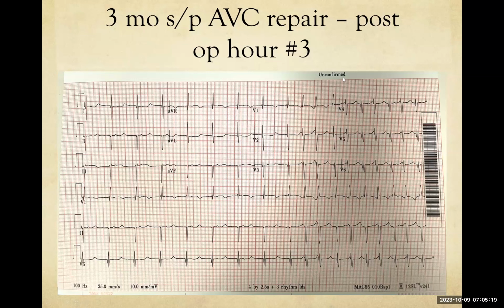Very good, Molly. So we're looking on the left-hand side of the screen. We see, just like you pointed out, I'm pointing here in lead 2 to some upright P waves that seem to be following the QRS. I think we can, with reasonable certainty, know that this P wave is not conducting to that QRS, because the ventricle hasn't even repolarized yet.